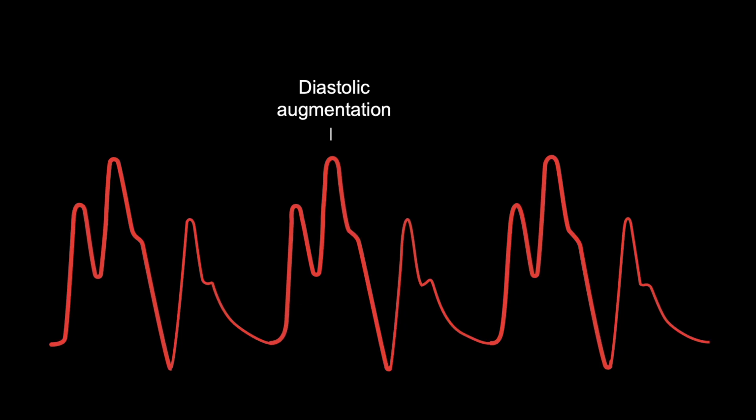The peak diastolic pressure is the only one that increases with assistance, as we remember that the balloon inflation causes diastolic augmentation here. There is no such augmentation on the cycles without balloon inflation. But, and this is important to remember, the numeric reporting of diastolic blood pressure on the console shows the end diastolic pressure rather than the peak diastolic pressure, so it is the lower number.